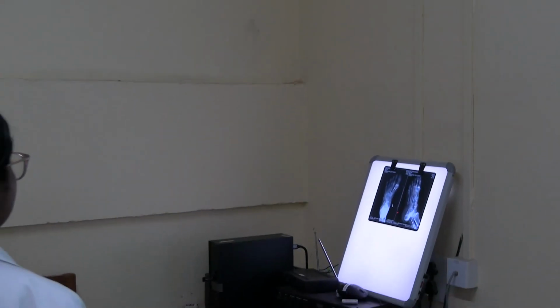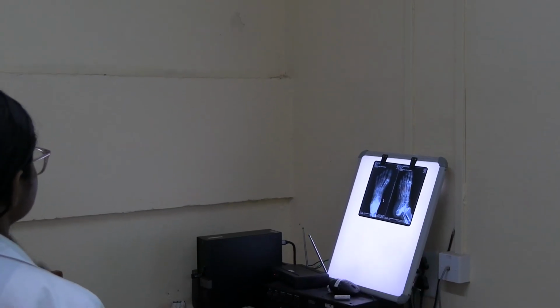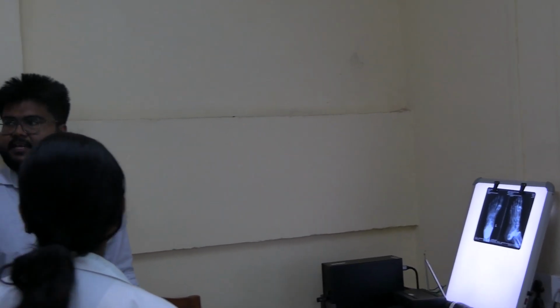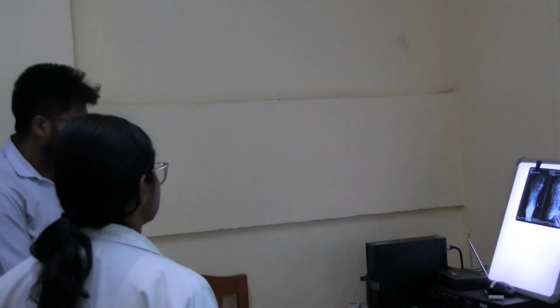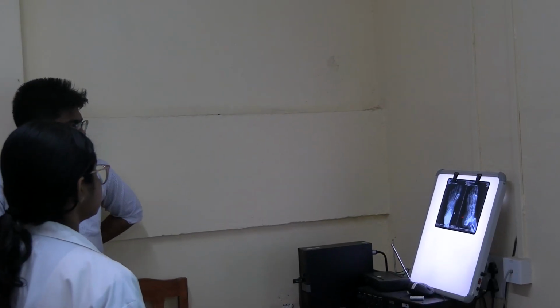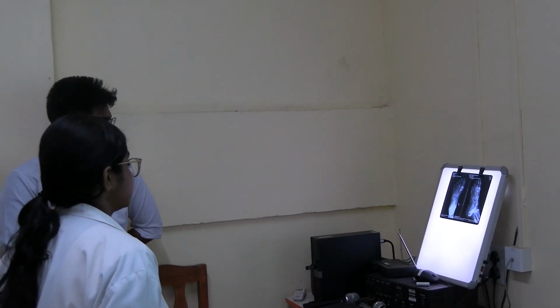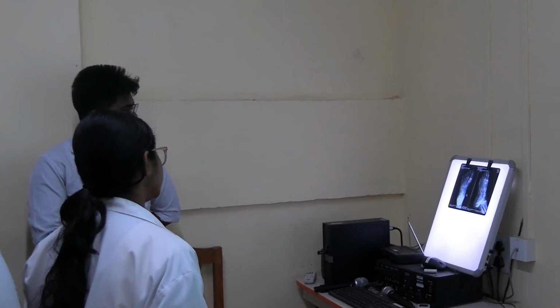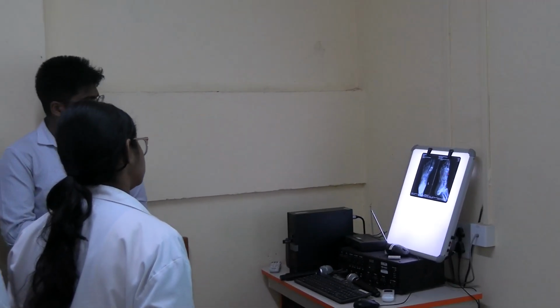Foot, which view? AP view, because if it is lateral, it will look different, okay? AP view, and L means left side. Left side. So you can easily identify, because it is the left side, your toe will be medial. So just identify this is the calcaneus, talus, navicular, cuboid. This is a cuneiform. This is a metatarsal.